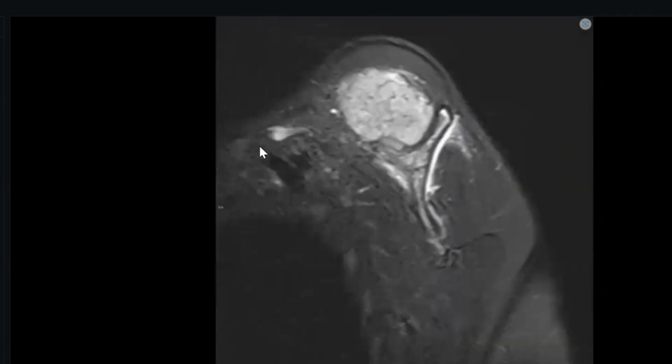Okay, the patient is 20 years of age. The top differential for any bone lesion is metastasis. It is very big. She is 10 years. Okay, fine. So 10 years with a bone mass in a flat bone, my top differential would be Ewing sarcoma. Excellent.